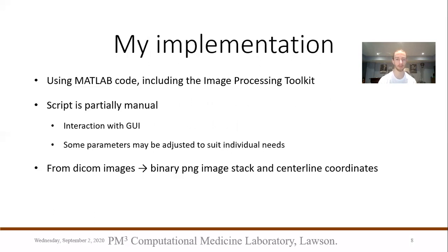Now I'm going to walk you through my specific implementation, each of the steps that I took, and show you my MATLAB code. My MATLAB code uses some functions from the Image Processing Toolbox, which is great. It has lots of capabilities for processing DICOM and other medical images.